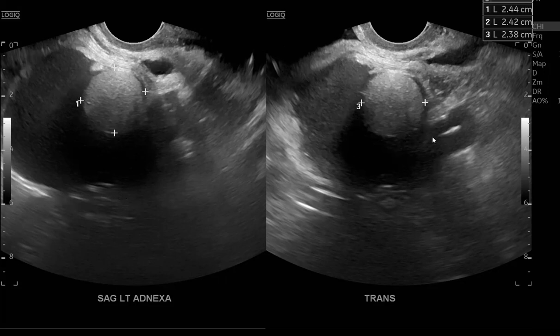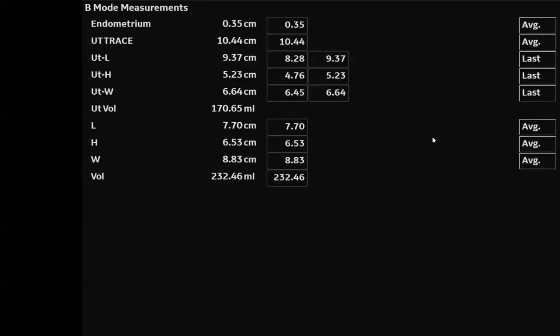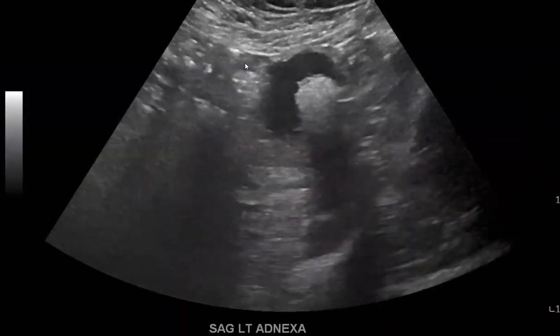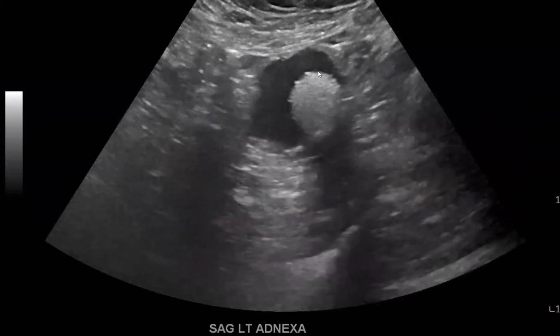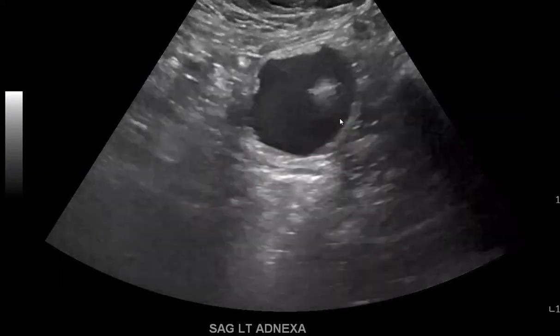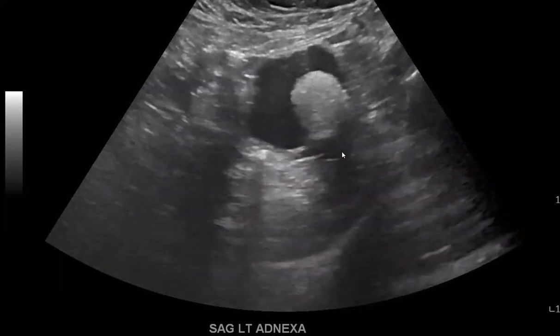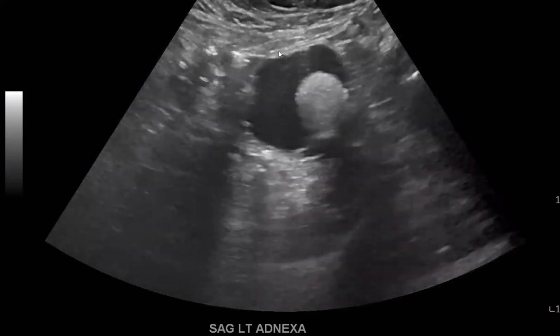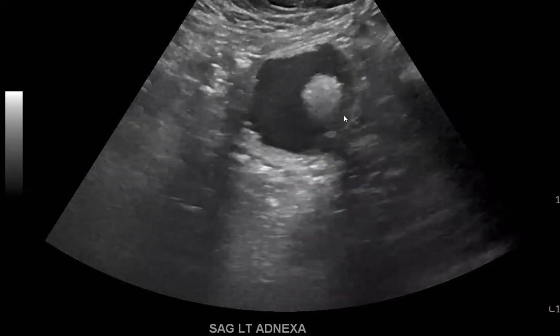and we will look closer at this finding on the cine images, and these cine images show the cystic structure with an eccentric hyperechoic mass lesion, and this mass lesion demonstrates posterior shadowing. So this is a hyperechoic mass lesion demonstrating posterior shadowing within a cystic mass lesion.